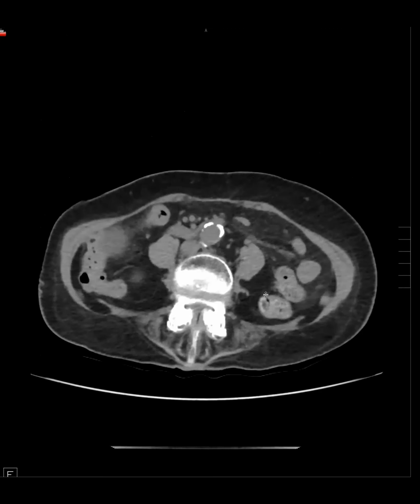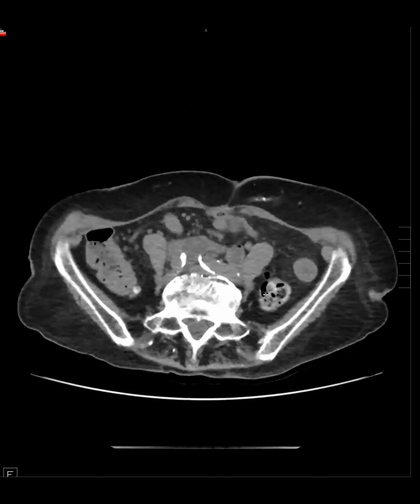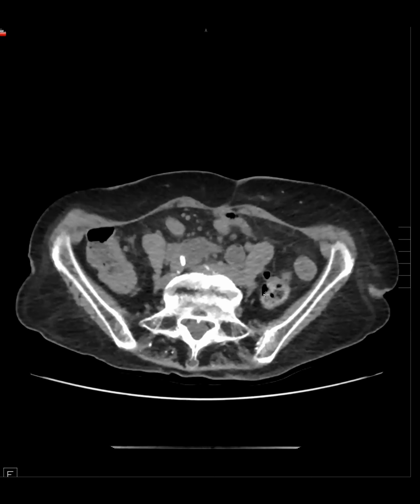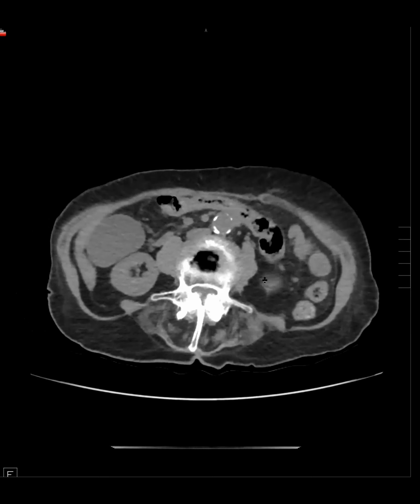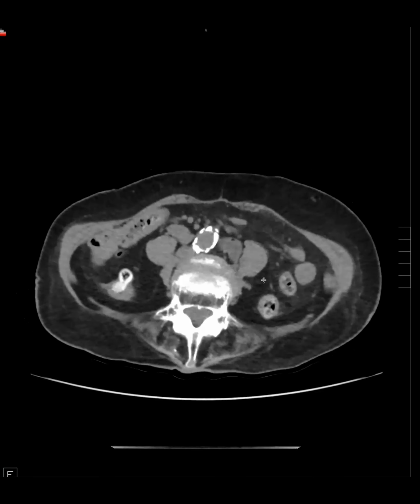So this second case is a patient with a history of gastric cancer, remote history, like over 10 years ago or something like that, new to us, and had a non-con CT just for abdominal pain. I'm showing this because it's non-con, we don't have oral contrast or anything like that, and so this is more of an eye test. So what do you guys think?